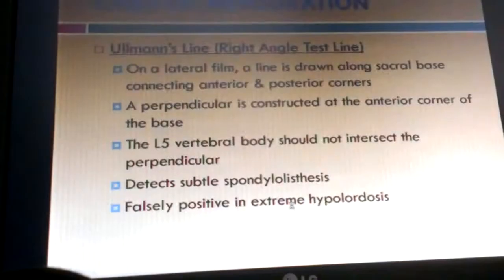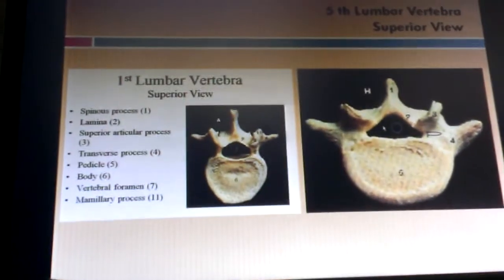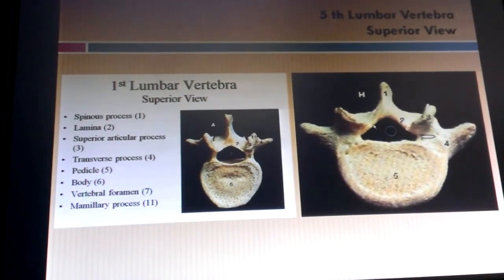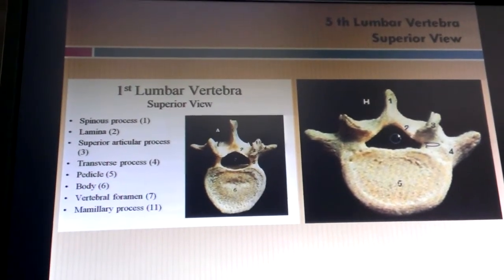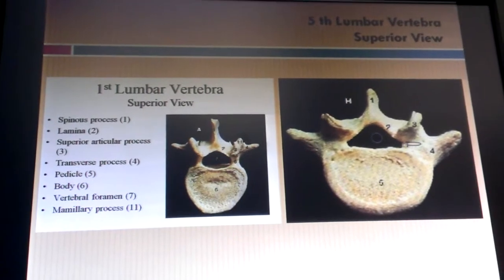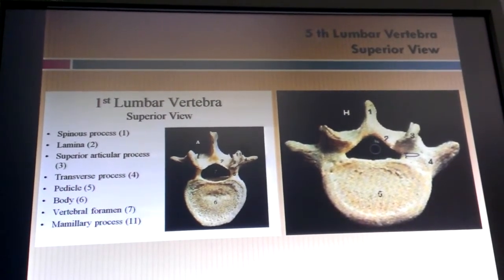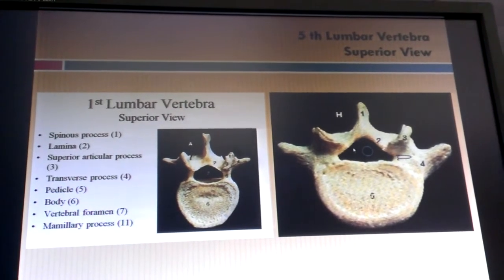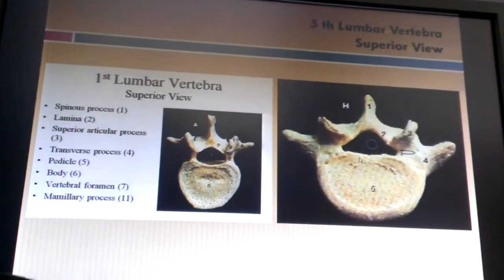Actually, let me go back here for a second. The trifoil would be where this area in here is kind of narrow. So you would have one of the clover leaves there, one of the clover leaves there, one of the clover leaves there. And so this area kind of pinches it off so that you've got your three-leaf clover, one here, one here, one here, and these narrow areas here are narrow.